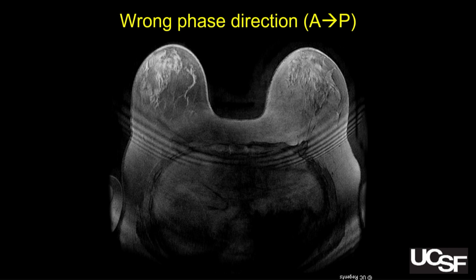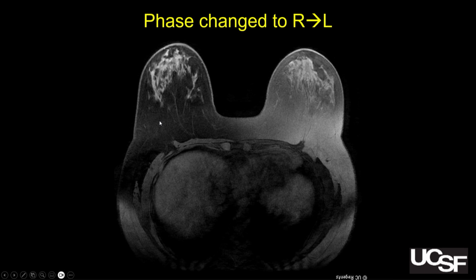And that's what's going on, and it's because it's dark back here. So you have the black stuff phasing forward. The phase was changed to right to left, like it's supposed to be. And now, again, I'm troubleshooting all of this without seeing the images. I only saw these after the fact, but the radiologist did a great job describing.